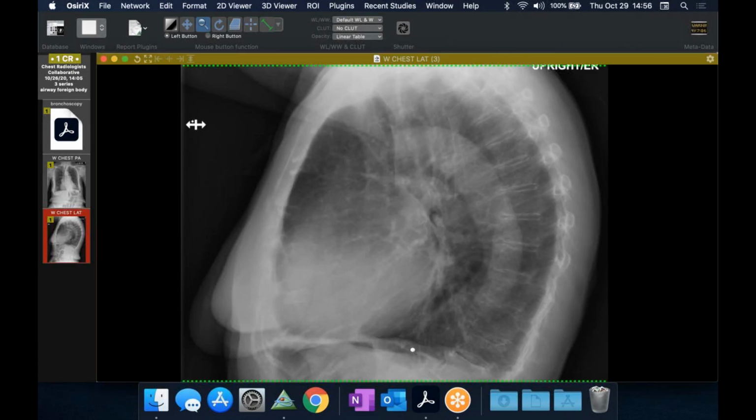But it's interesting that it's not really floating so much on the surface of the fluid as it is just inside. Right. Yeah. Here may be some of the, I don't know, I think this may be part of the process down in here, these little soft tissue nodules. But yeah, it was nice of him to share that. Really just a cool case.